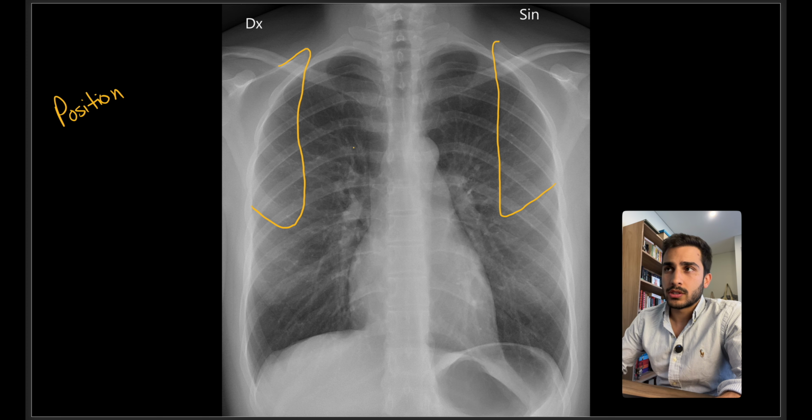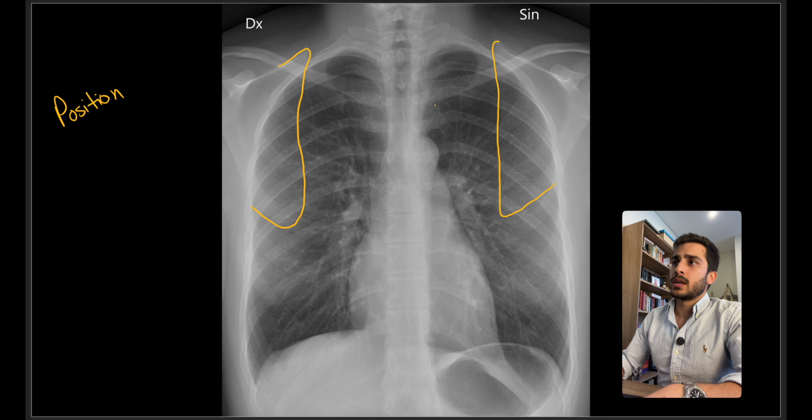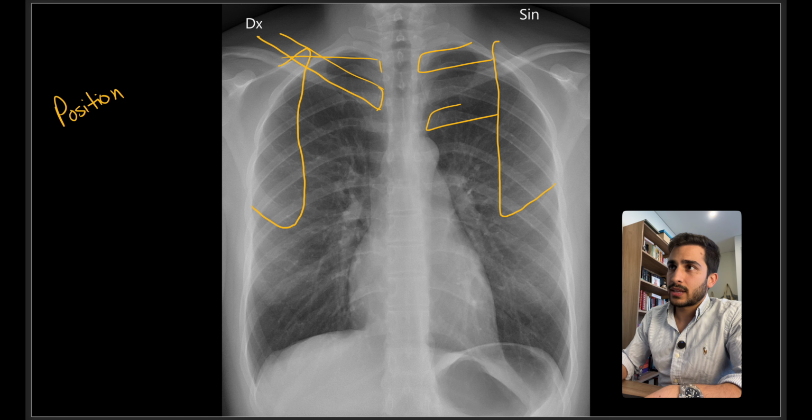So that's the scapula. Now I also mentioned the clavicle in terms of whether the patient is leaning forward or leaning backward, aka kyphosis or lordosis. So that will indicate whether it's quite high or it's quite low. But the clavicle can also be angled as well. So it can be angled very steeply like that, or it can be really, really flat, okay?